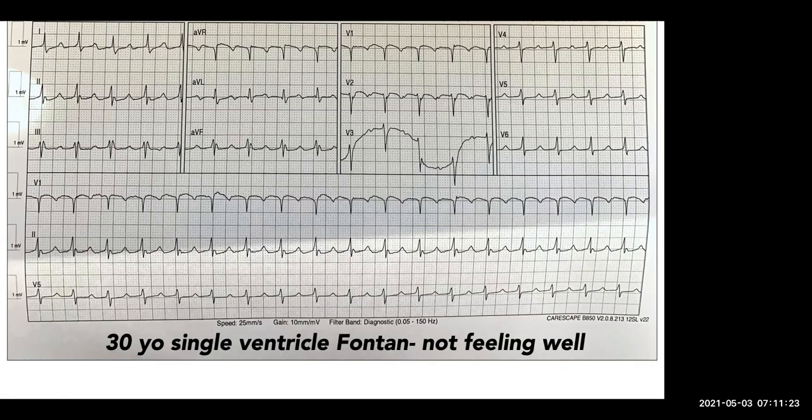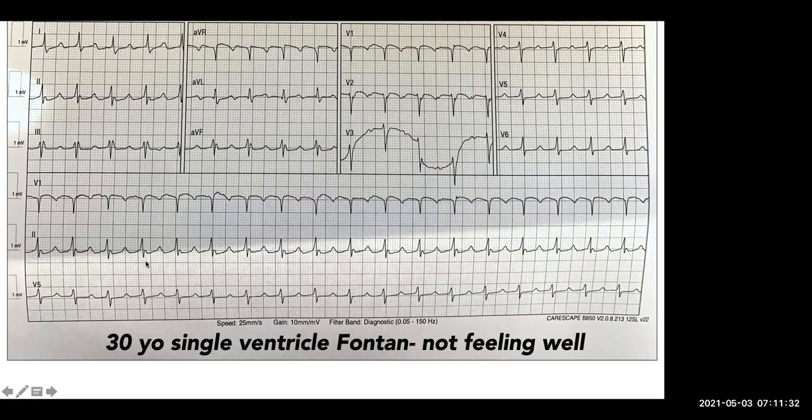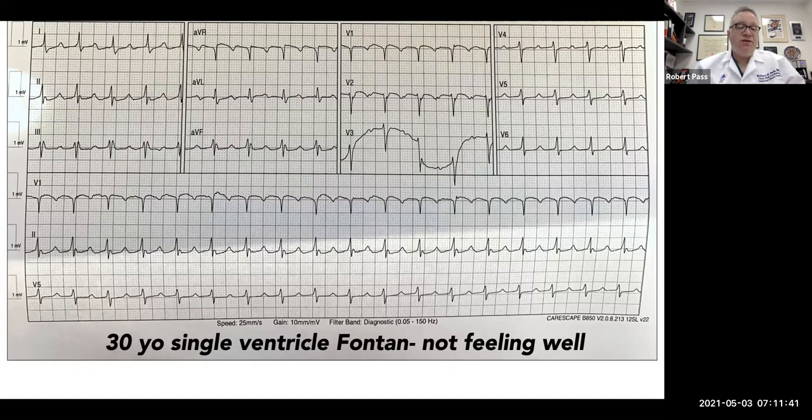But then right after the QRS on the T, there's another deflection. Yes, this here. That's another deflection, but I don't see it in other strips, so I don't think that's of importance. That's a good way to determine whether you're looking at a retrograde P wave or not. If you don't see a similar deflection in other leads, then it's probably more likely just part of the morphology of the QRS and not a retrograde P wave. So that's a good way to look at it.